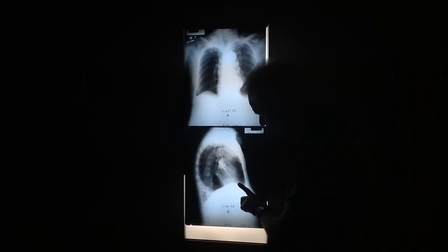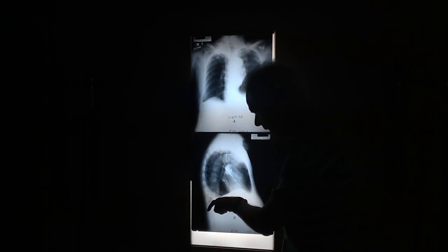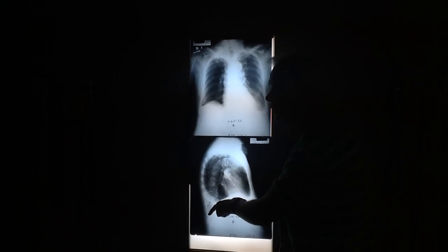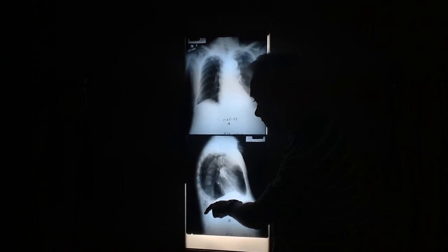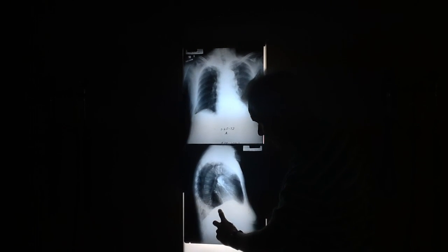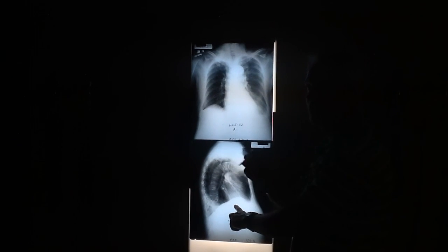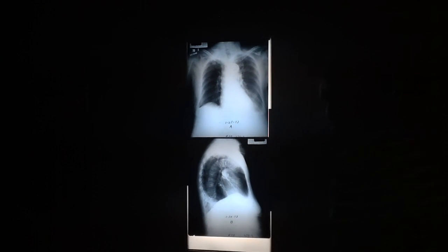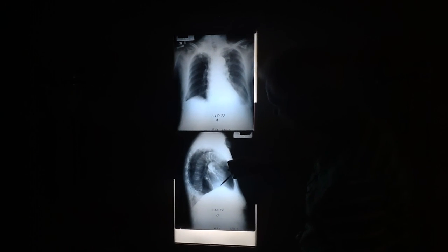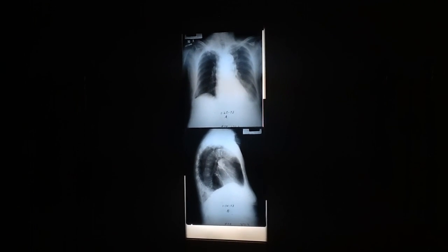And so then this border would come along like this and go right up there. And you wouldn't have this except for the one on the left side. Exactly. You'd see the left side over it then. And then the left one would come along like this and disappear where it runs into the heart, which is a normal anterior silhouette. So the diaphragm that you see over the top of the heart is the right one, unless they have dextrocardia.